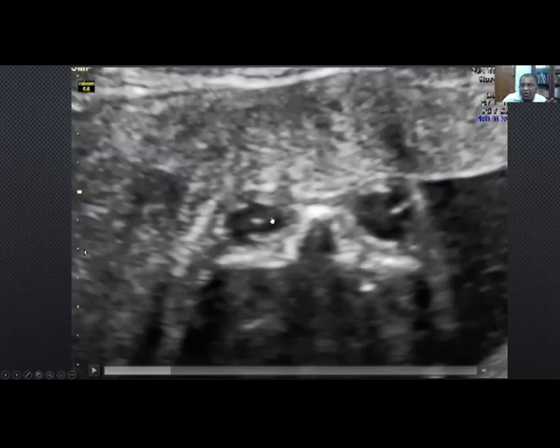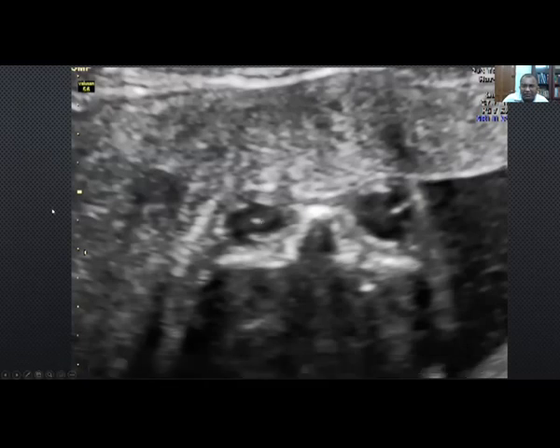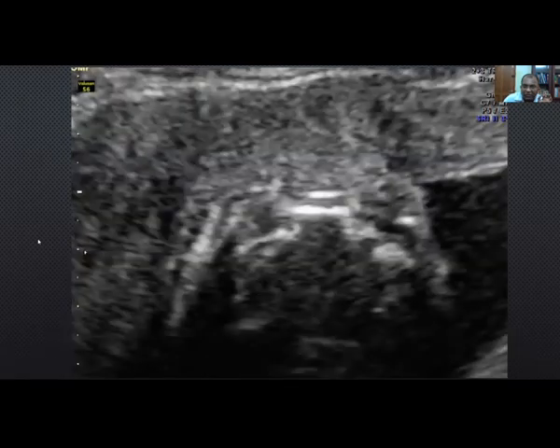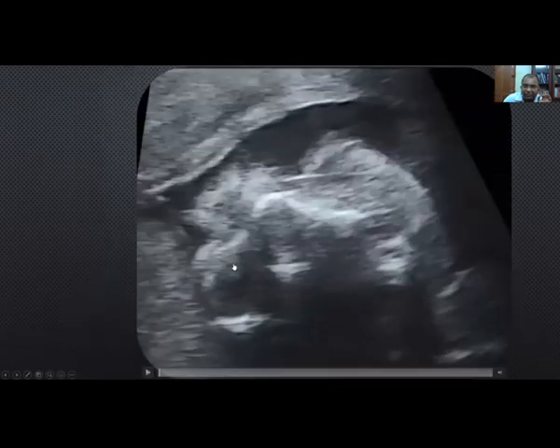These types of abnormal orbits are likely to go into anomalies. This is what we need to search for. This is what we need to document and point out in our anomalies. And this is a tendency towards microophthalmos, and it might end up as anophthalmos.